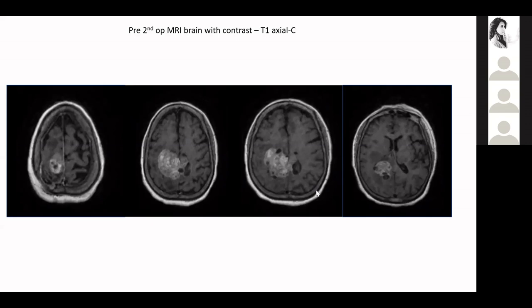So if we consider the previous images from May 2020 over an interval of 5 years, on T1, as it is labeled that these are T1 post-gadolinium images, there is significant interval increase in the size of lesion in the surgical bed, and it is almost like many times doubled in its size. It is more on the right of midline, and it is again adjacent to dura.